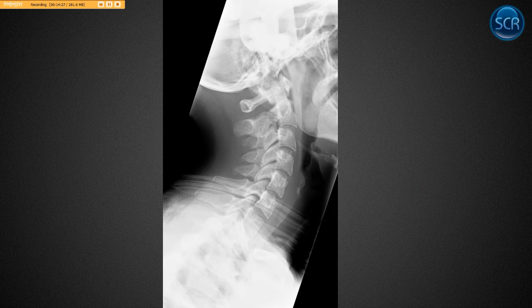All right, what was I trying to show in this one? Looks like this person's in some type of immobilization device. They've got a hangman's fracture here. Okay, so we look at this one, we follow this down, maybe a little spondy there actually. Traumatic spondylolisthesis at C2, most common cause is a hangman's fracture. We go back here to the pedicle pars region, and you can see that there's a fracture across this.